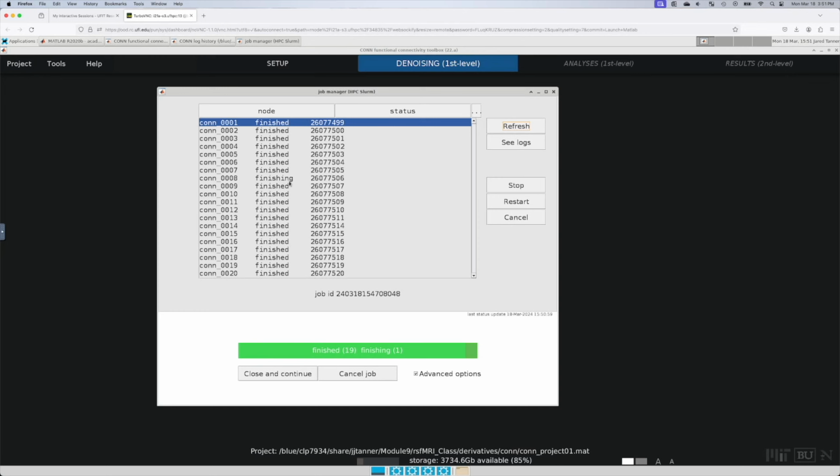We've done some initial pre-processing, which in that case is skull stripping the structural scan. It is moving the structural scan into a standard space, kind of a template brain, which forces everyone's heads to go into the same space, essentially the brain. And it does some smoothing of the functional scan and some other pre-processing. Again, we're not going to cover exactly what it's doing. This is just a first pass at getting your feet wet with this.